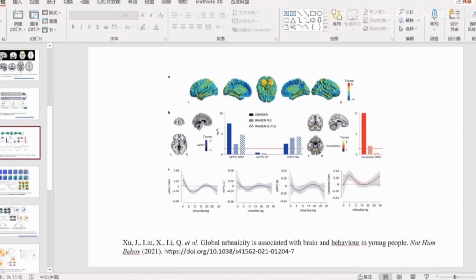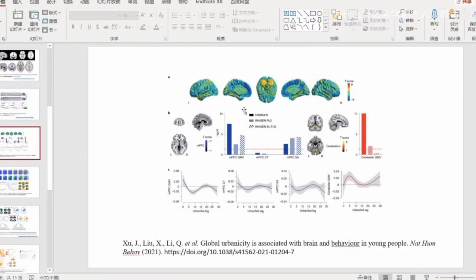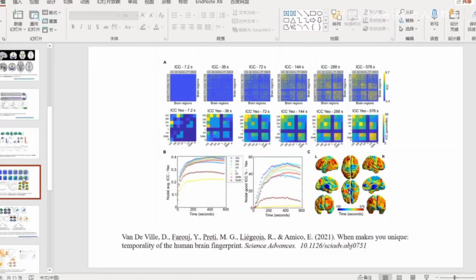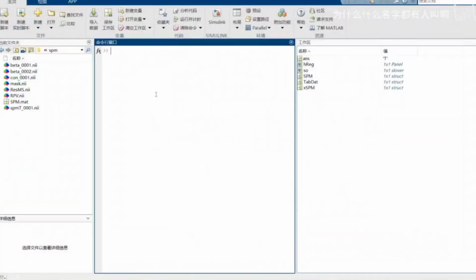Have you ever thought how to produce images like these paper, these brain images? We always see, when we are working with medical imaging data, especially the neuroimaging data, this kind of brain images in a lot of papers like Nature, Springer, but most of us don't know how to do this. So here's the tutorial on how you can produce these images.